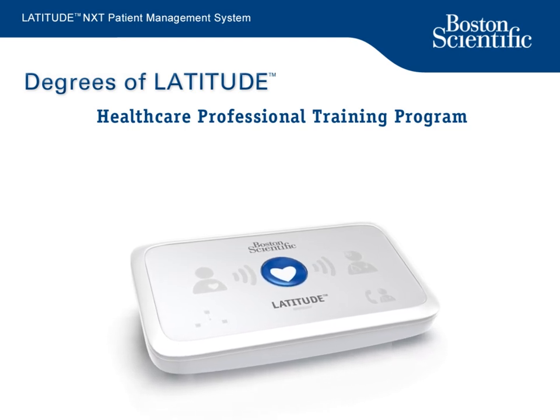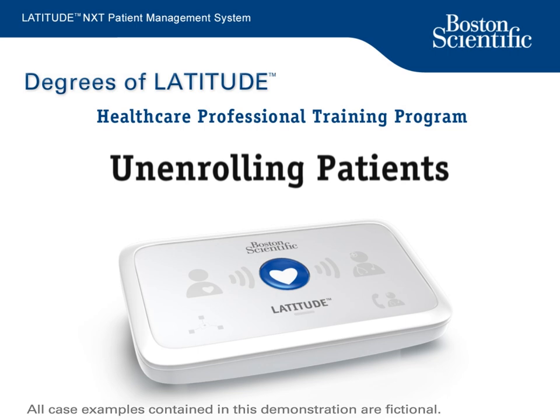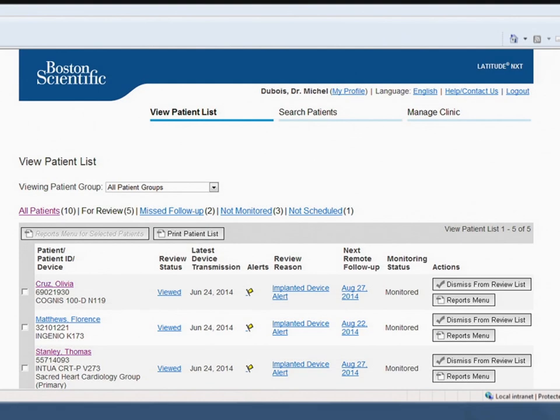The LATITUDE NXT website offers you flexibility and control over how you receive, review, and manage Boston Scientific device and patient data. In this training module, you will learn how to unenroll patients in LATITUDE NXT. Unenrolling patients through LATITUDE NXT is simple. Once you're logged into the LATITUDE NXT site, select the patient you wish to unenroll by clicking on their name.